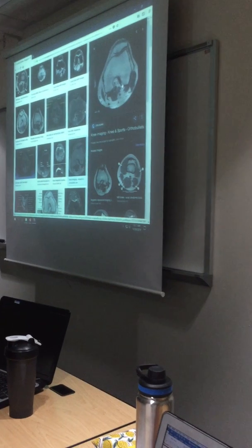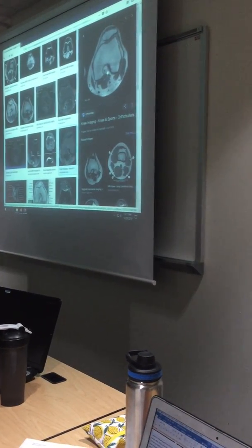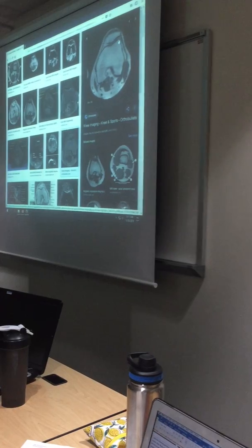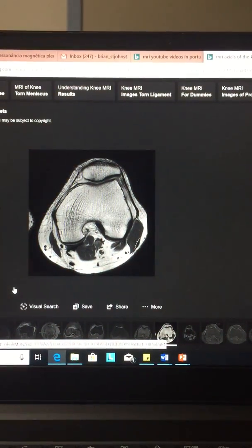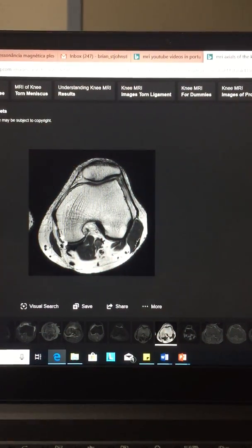Okay. Now, here's another trick when we're looking at these axials. Your lateral condyle is going to be flattened and straighter. The medial is going to be more rounded. Can you see how this is more flattened and straight? And this is more rounded? This is your lateral condyle. Okay? Does that work for everybody? I can tell on these two, unless they're shaped abnormally.